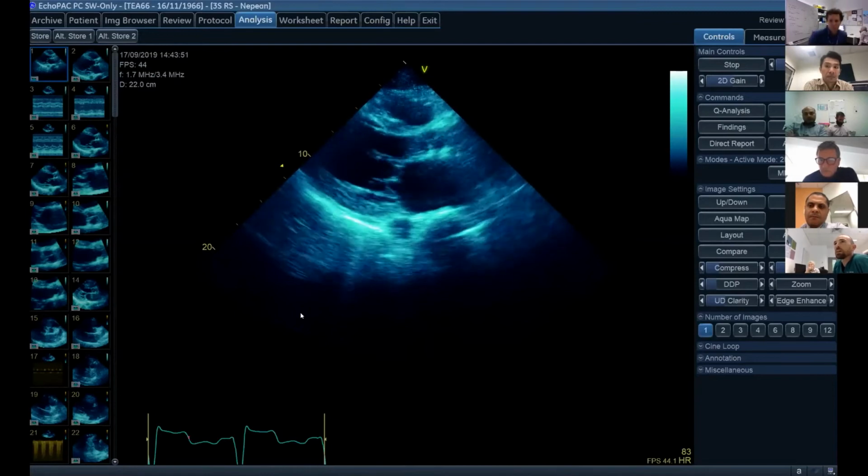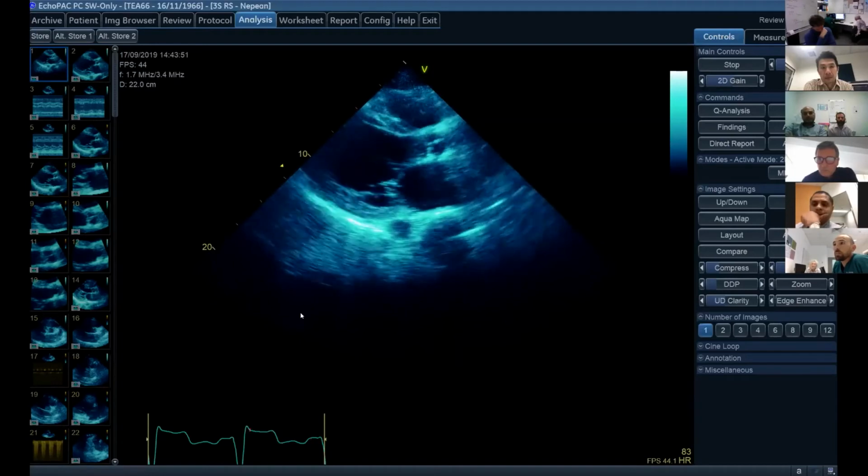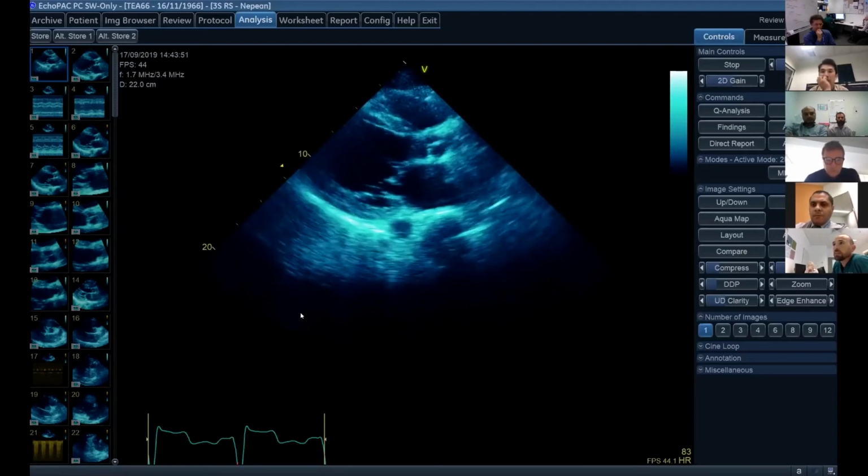So moribund. He'd been admitted with syncope and a troponin rise, called a non-STEMI, and had a Met call from a monitored bed. He was intubated and put on metaraminol infusion and went to the cath lab immediately, where they found occlusive triple vessel disease.